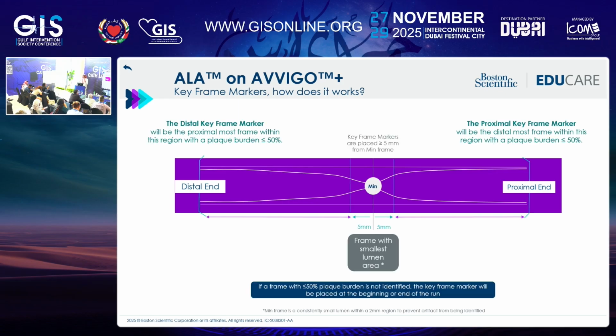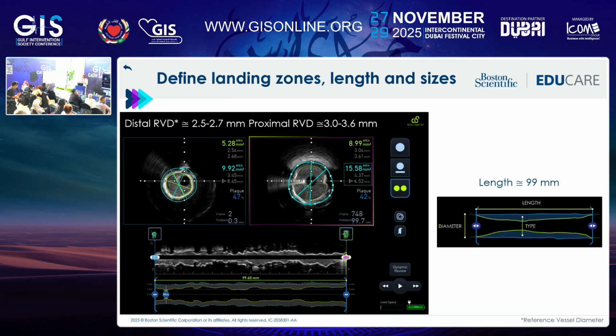I'm just going to skip to that because I want you to identify in the run what is, yes, so see, even me that I use IVUS, if I did not follow the pathway, I will forget. We spent the time looking at calcification and our minimal lumen, but we did not discuss what is the length of our lesion and what is the reference diameter. So I just need the help of the team to highlight how is the lesion length.